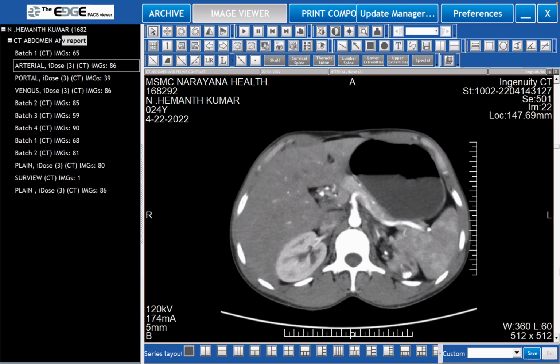If there is so much dilatation of the pelvis, does it make you wonder why there is no dilatation of the PCS? Sir, there is no dilatation in PCS because... No, that's what I'm pointing out to you. If the pelvis is so dilated, the PCS is not dilated. Is that strange? Does it warrant some other thought processes in your mind?